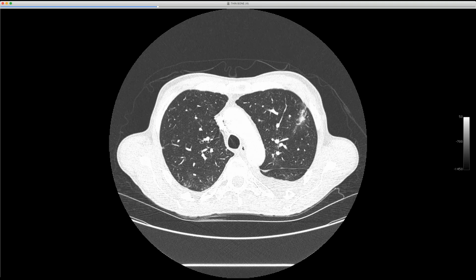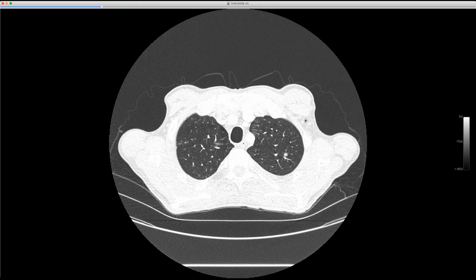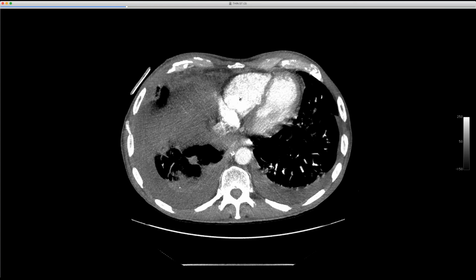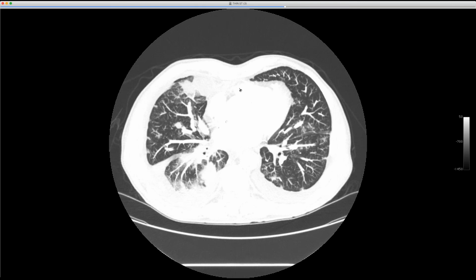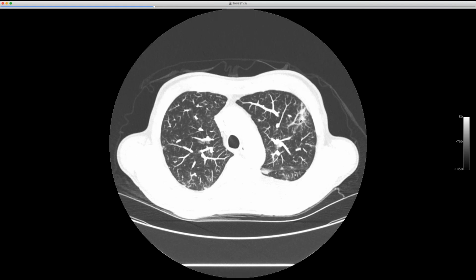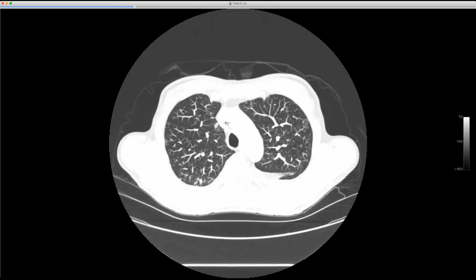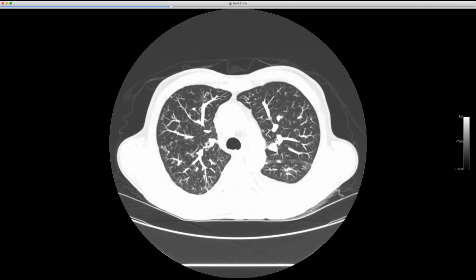Wow, it's a good thought. I guess. Wow. I don't know. There's just, if I put them up in a MIP, for example, let's make some MIPs. Here, we'll use the smoother algorithm. Just see, it's all centered around these venous branches. See how you got all these little nodules marching along the vasculature. It's purely a curiosity.